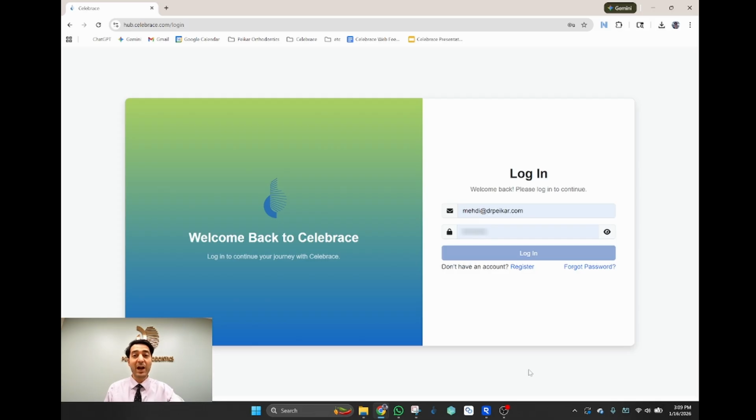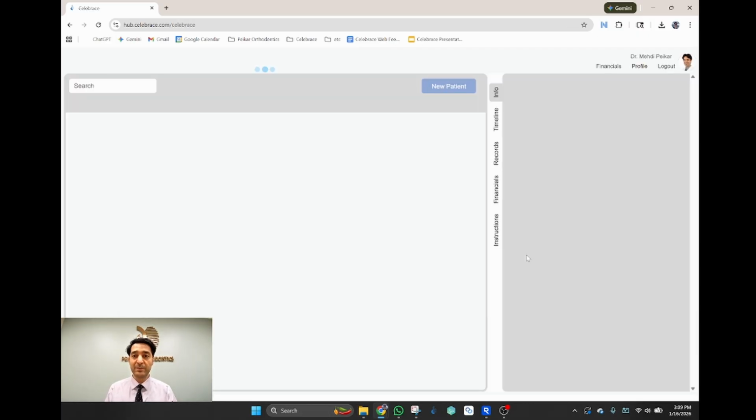Today, I want to tell you how you can submit a patient to Celebrace software to receive custom brackets and indirect bonding trays. So it's very straightforward. You go to hub.celebrace.com and you put your email and password and you click login.